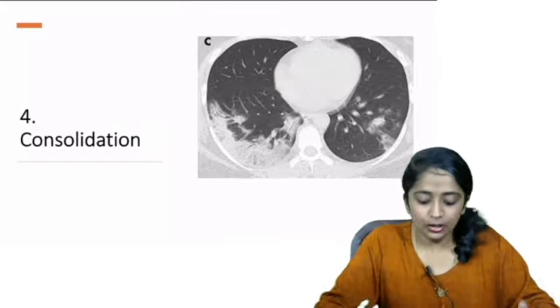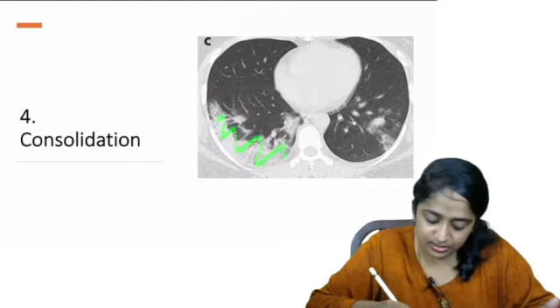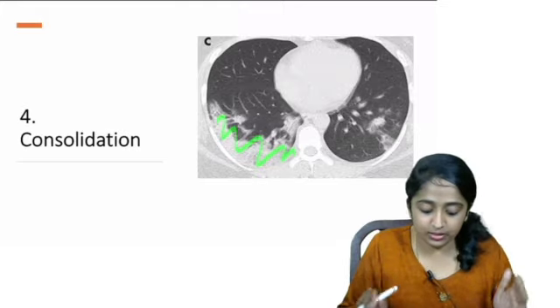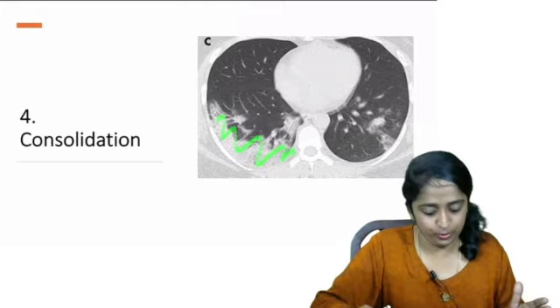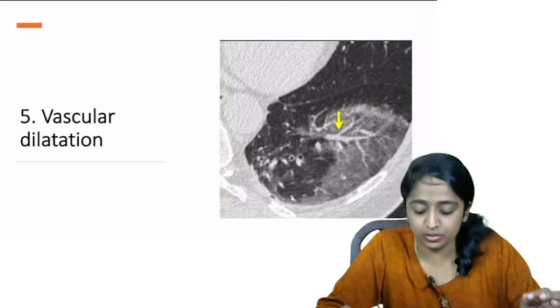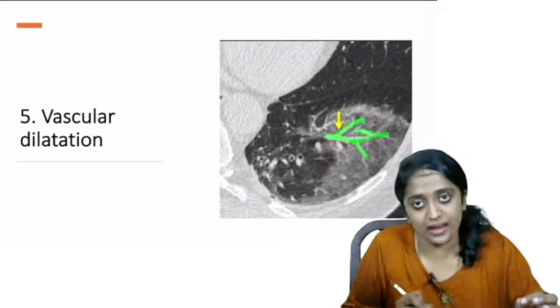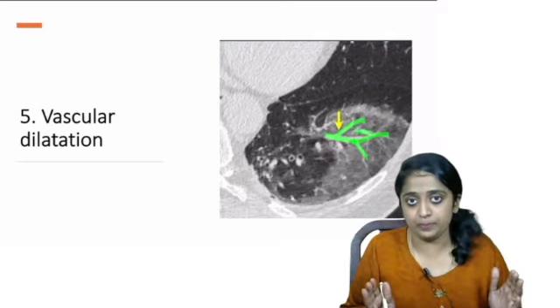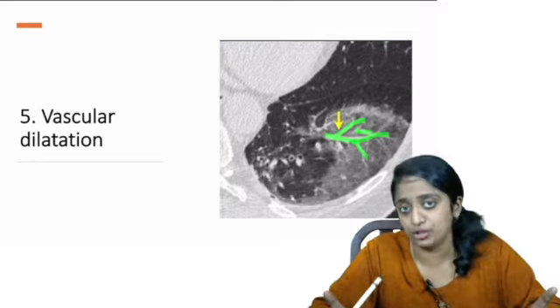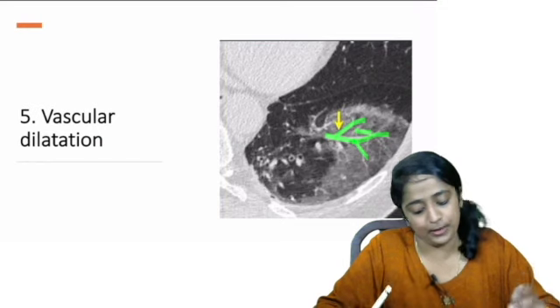Like this. And finally, the typical consolidative pattern where you get dense infiltrates obscuring the lung markings. Very important. And of great significance is the recently described vascular dilatation that you can make out within the opacity. So I said in the ground glass opacity, if you can see the vessels are very prominent, that is a supportive feature. Supportive feature of COVID-19 lung manifestation.